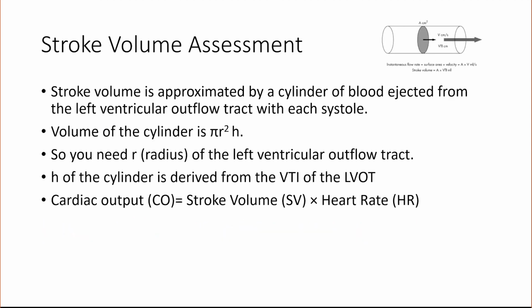Okay, so lastly, we'll talk a little bit about stroke volume measurements. Stroke volume measurement is also very useful. It's very useful when you want to see if giving volume to a patient is making an impact in increasing the cardiac output. To do that, we need to be able to measure the stroke volume.